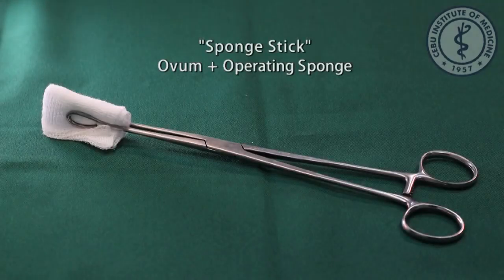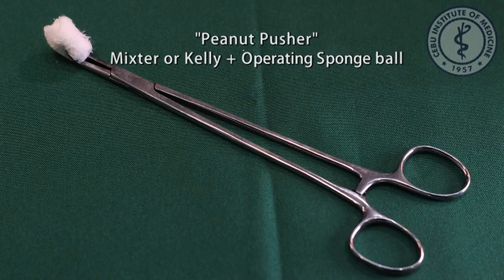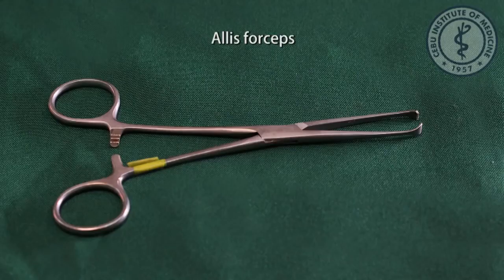Ovum forceps, sponge stick: ovum forceps plus operating sponge, for blunt evacuation of blood clots such as in exploration. Mixter forceps, peanut pusher: Mixter or Kelly plus operating sponge ball, for blunt dissection. Babcock forceps, for grasping hollow or visceral tissue. Allis forceps, for grasping connective tissue.